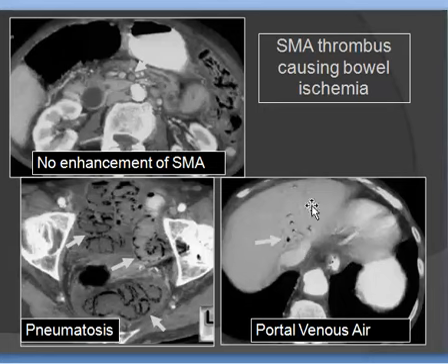So we have sequelae of superior mesenteric artery thrombosis as non-filling, thick-walled loops, pneumatosis intestinalis here and there, and the presence of portal venous air.